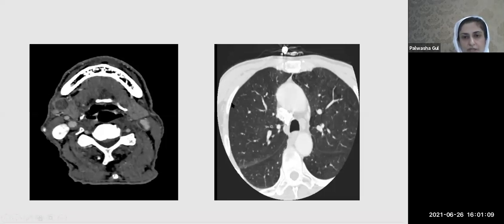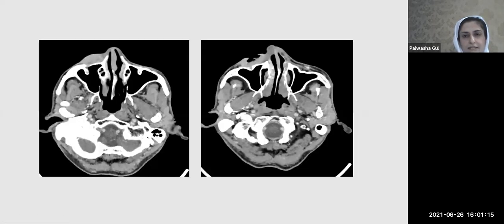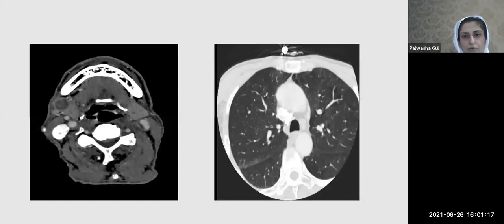So this was actually a biopsy-proven squamous cell CA. So from exam point of view, just see the necrotic lymph nodes, cutaneous lesion, and then tell your examiner that you are specifically looking for cavitating metastasis in the lungs. The examiner might ask you, if you would put a needle in this lymph node, let's say ultrasound guided FNA, or ultrasound guided biopsy of this lymph node, would you do that?